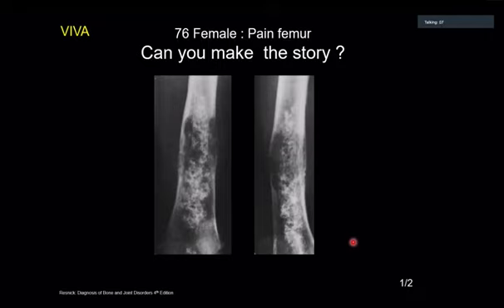Overall, the findings are suggestive of a bone infarct with possible malignant transformation within it and a fracture through it. I would be very keen to compare with previous X-rays if any are available, to see the change, whether it is a change of a pre-existing bone infarct or a transformation into malignancy. I would urgently refer the patient.